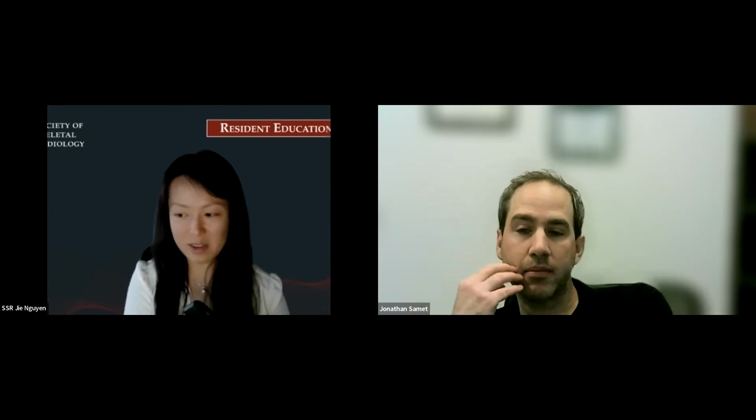For kids who are sick with chronic disease, they can have red marrow hyperplasia, so that area could be a little bit bright, and sometimes a little patchy. So I do rely on my T1 to make that determination. Is what I'm seeing really real? Because a fluid sensitive image occasionally can look very prominent, like it's in your face, that you have to talk about it.